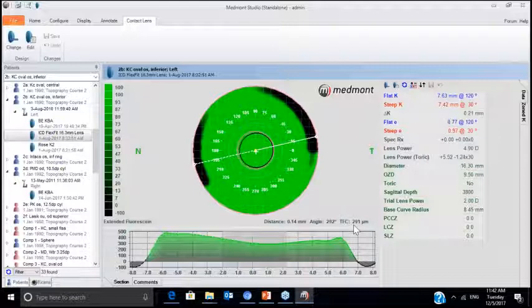And I might just place the scleral lens in the contact lens software over top of this eye to model whether we have the right sagittal depth, whether we can clear over top of the cone, do we need to go higher in depth, do we need to go lower in depth. So the ability to place this lens on the eye surface is very helpful to us in figuring out, do we have the right contact lens?